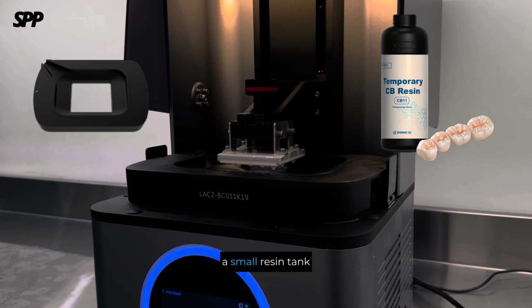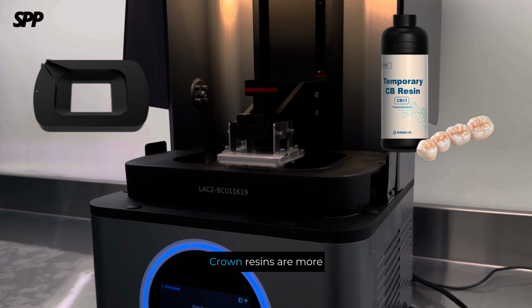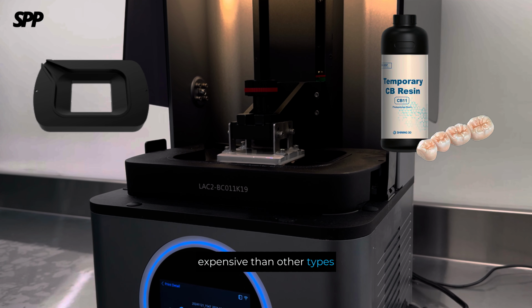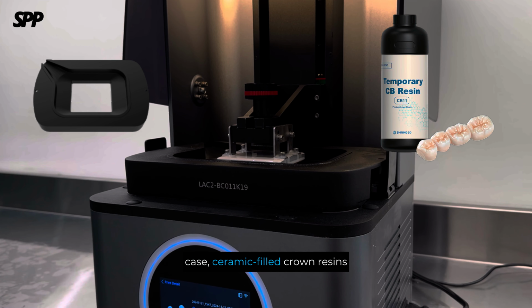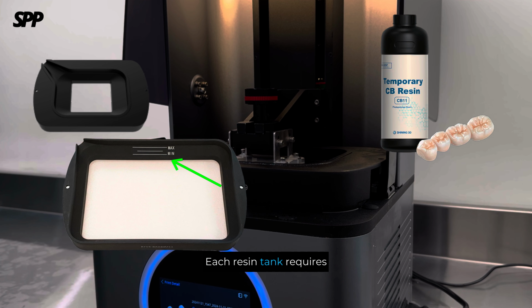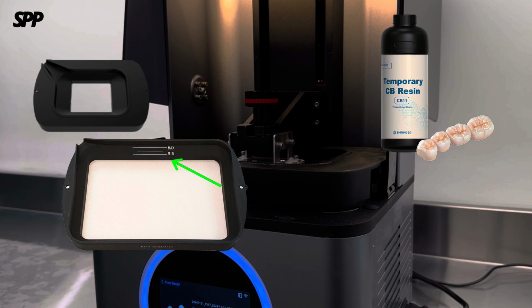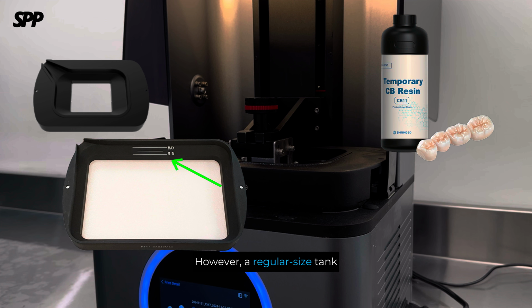The reason I use a small resin tank and a small build plate is cost efficiency. Crown resins are more expensive than other types of resin. Although I used temporary crown resin in this case, ceramic-filled crown resins are even more expensive. Each resin tank requires a minimum amount of resin. With a small resin tank, only a small amount is needed to reach that minimum level. However, a regular-sized tank requires a much larger volume of resin. That is why I use a small resin tank and a small build plate.